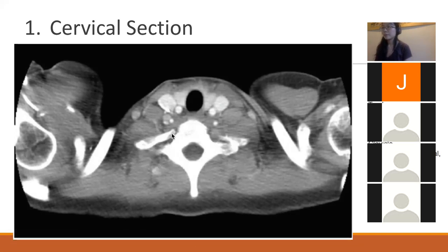It looks like we have two little rib-looking things coming off of it. And then what bone do you guys think this is? Remember, we're at this level right here, so we're catching just the very back of the clavicle. The clavicle is going to travel forward more here, and we're just catching the very end of it. And then what bones do you think are here? Keep in mind that the patients are positioned like this. So if the scan is taken at about this level, what bone do you think that is? It's going to be the humerus, right?